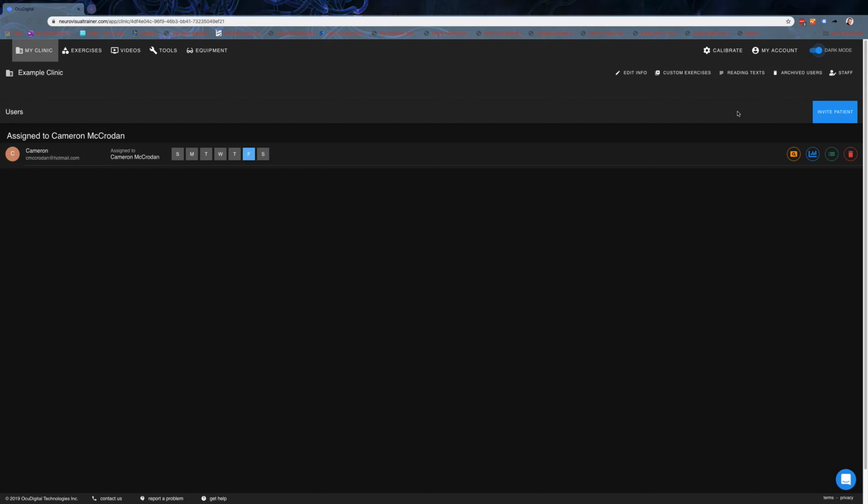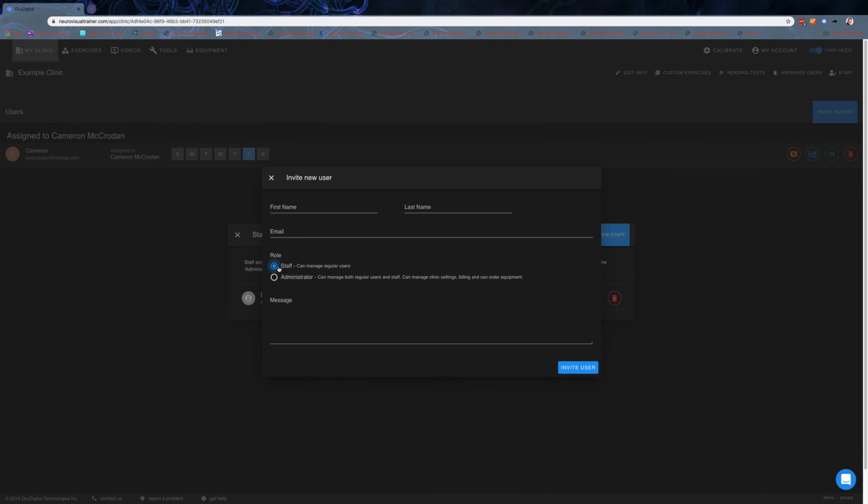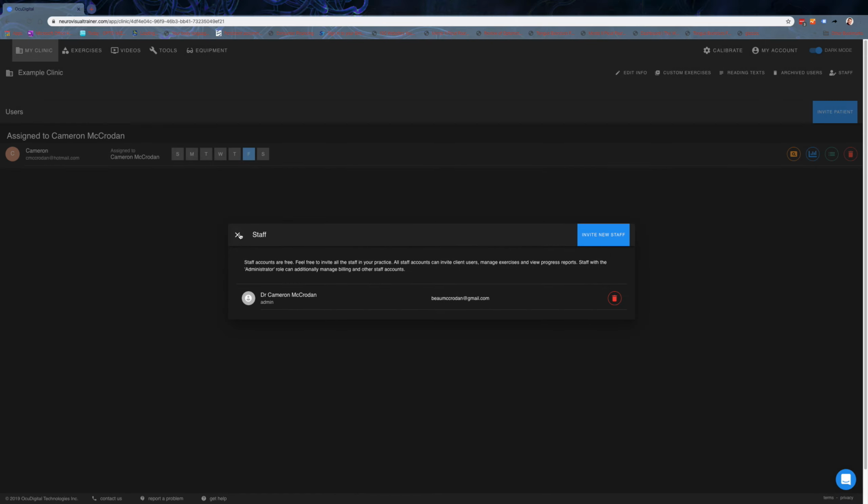So the next thing a lot of you are going to want to get into right away is adding your staff. So click on the staff button. You can go through, you can invite new staff, whether they're staff or administrators. You can get them all set up on there.